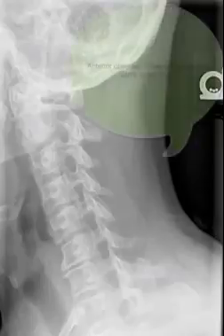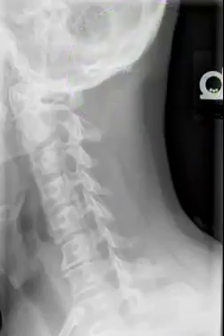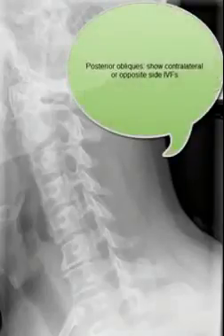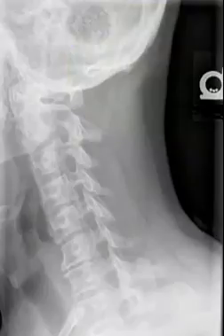In general, anterior obliques show you the same side IVFs, meaning that if you take a right anterior oblique, for example, you'll be visualizing the right IVFs. The opposite is true for the left IVFs in anterior obliques. When we're taking posterior obliques of the cervical spine, you will visualize the opposite, or contralateral, intervertebral foramen. For example, if a left posterior oblique radiograph is obtained, the right IVFs will be visualized. So this is more of a question-and-answer type situation.